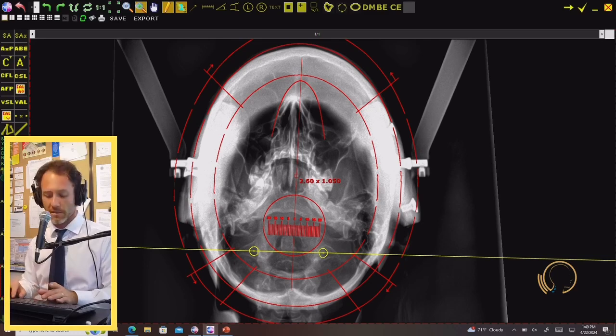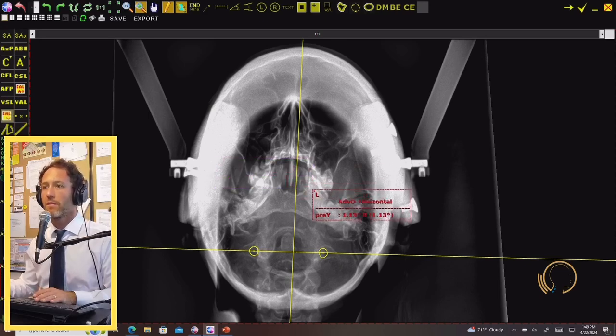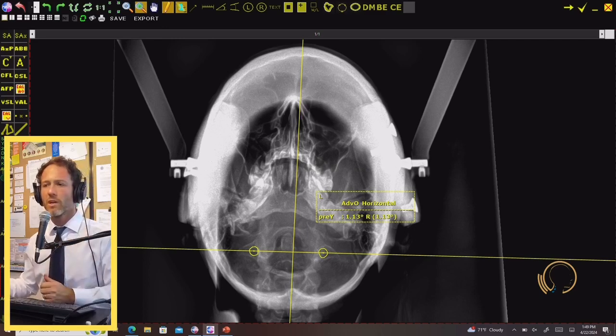When you start splitting hairs, it's time. But that's going to be your two lines that you're pulling your rotational measurement off of. And then that cal V will give you what you'll drag into your frontal film to make up your final analysis. So I hope that was helpful. I hope the slides helped because that's a little bit difficult to explain sometimes, those masses.